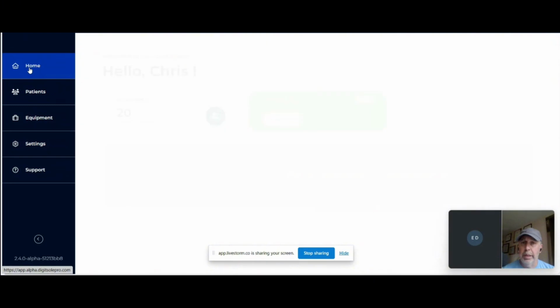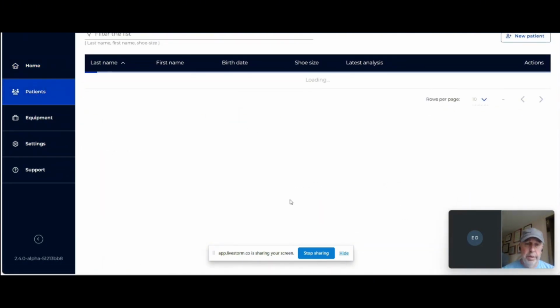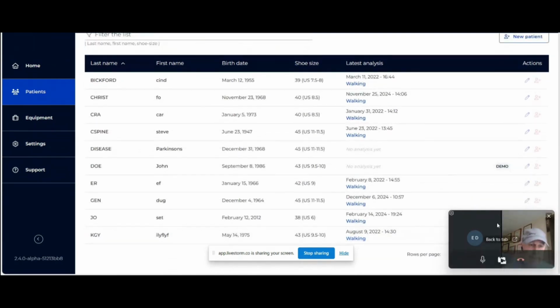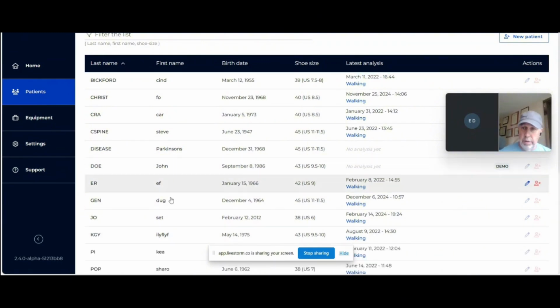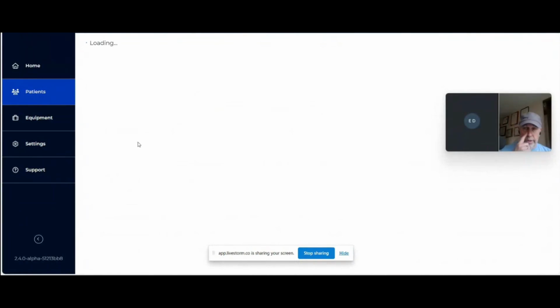So let me go back up to here. I'm going to click on patients. I gotta move my picture. And so you can choose your patient.